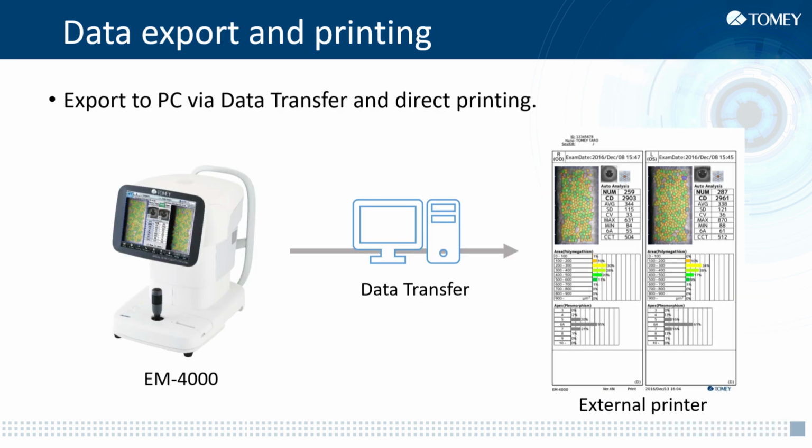As for more about export and printing, the EM4000 can not only export data to a PC through data transfer but also print out with an external printer without any additional operation.